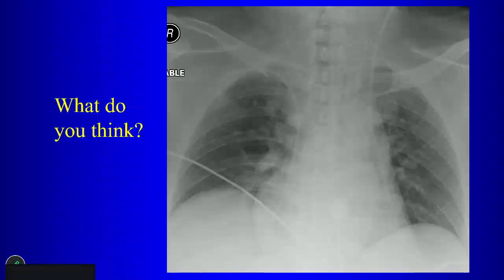Okay. Secondly, what kind of blood? Because if you're worried the catheter is going into a branch vessel and got into the aorta, then what would be different about that blood as opposed to the blood you would expect to get from a venous catheter? It would be arterial blood, right? The possibility is it could be in a left-sided superior vena cava. Okay, there is another possibility when a catheter takes an abnormal course like that that might also give you arterial saturated blood. And what is that?